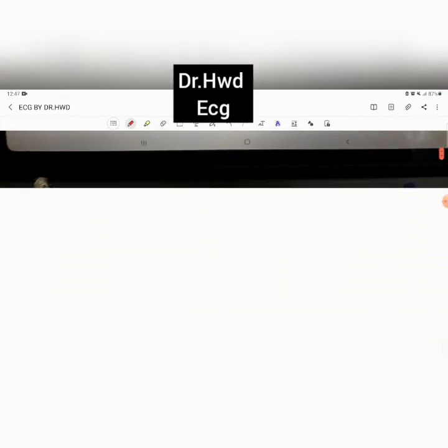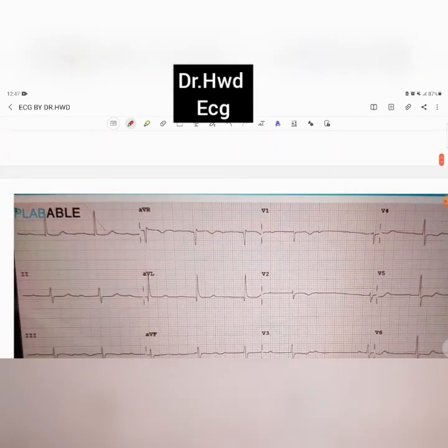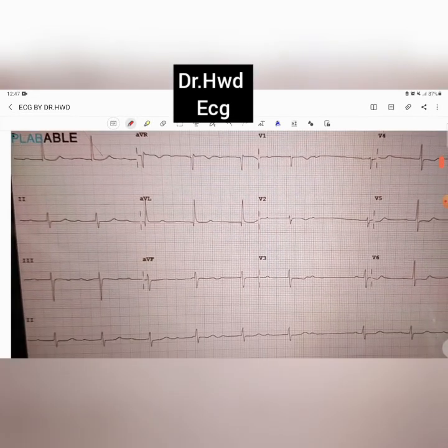We just look at the ECG and would determine. All right, over here. Now let's see what the first thing that you do. You look at the RR. You calculate the rate. The rate seems fine. Next thing you do is you look at your P waves. Do you see your P waves here? No P waves. Kind of no P waves. But here, look at this one. We do have your P waves, right? Okay, sorry, this is not your P wave.